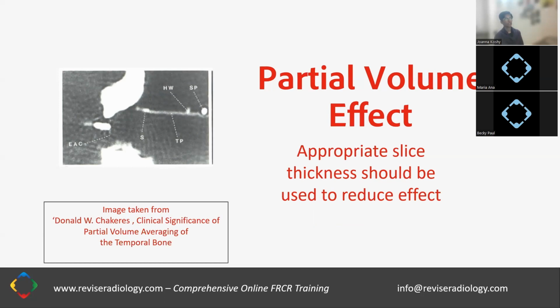If you look at the object which is titled as SP, you can see that it's very bright, and that's the proper attenuation of the metal object in the patient's body. However, the other structures are not as bright. And the reason for that is that they're smaller than the slice thickness, so the partial volume effect is happening.